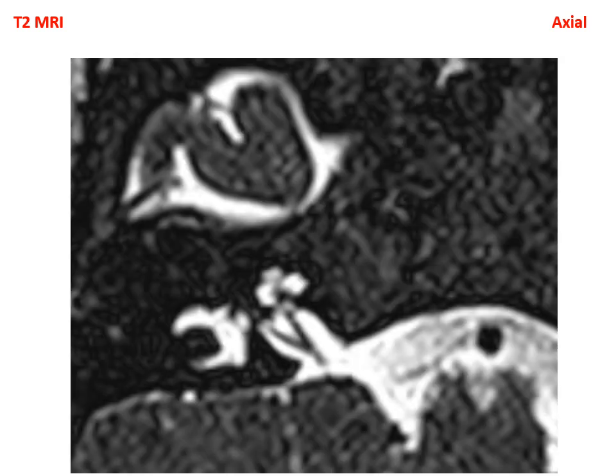If we move a little bit down, we can start to see the cochlear nerve anterior and the inferior vestibular nerve posterior. So the nerves again: the facial nerve superior, cochlear nerve inferior, and both vestibular nerves posterior. Of course the superior is first to show, and then the inferior will show after that.